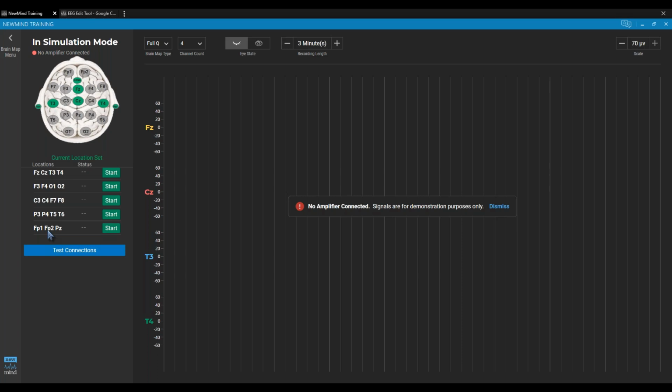So I just ignore the protocol recommendation and look at everything else. Generally I'm working more in the dorsal stream anyway, unless I'm working T3, T4. So if it is F7 and F8, I'm generally not as concerned.